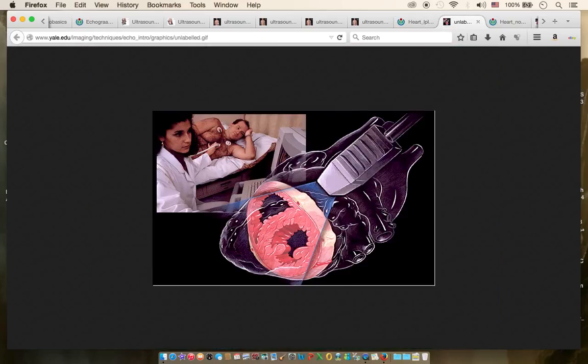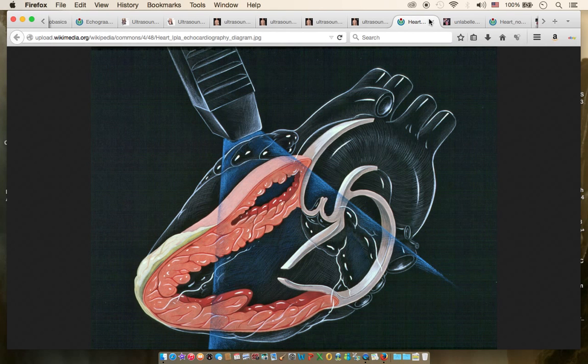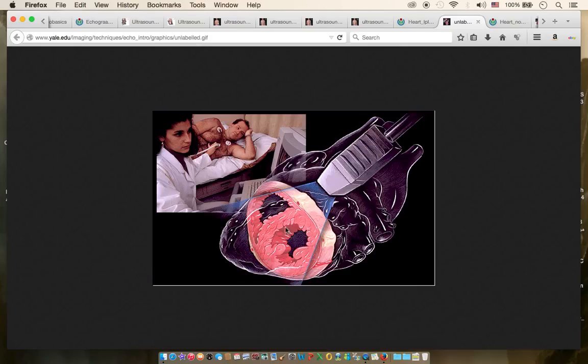Again, this is the structure when you do a cut section of the short axis view. Not like the longitudinal. In the short axis, you just see the left ventricle, which is concentric, and the right ventricle, which is above, or anterior, and it is eccentric, not concentric. It's a very important view to assess the left ventricular function, the ejection fraction.